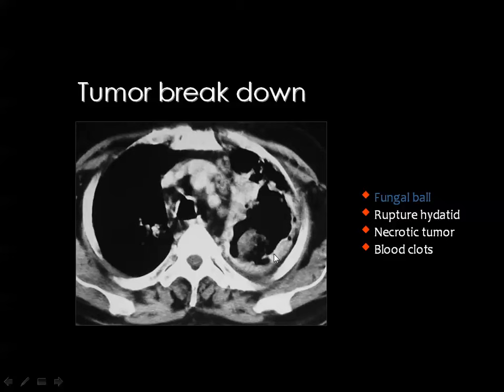If you see a cavity in the lung fulfilling the criteria of malignancy, which are a thick margin and an irregular inner wall, whatever the content of this cavity, you should diagnose malignancy. If the cavity is containing air or a ball or a fluid level, you think of malignancy, provided you have these two criteria: thickness of the margin and irregularity of the inner wall.